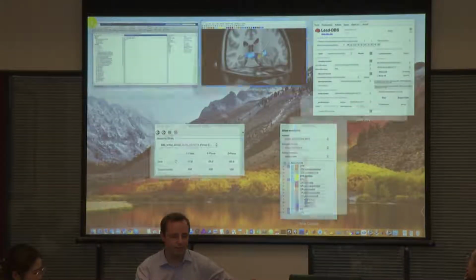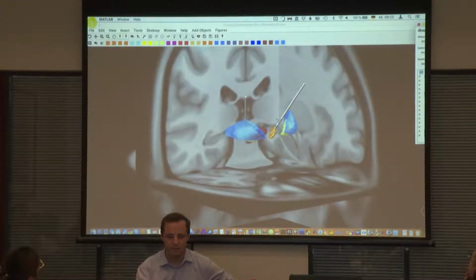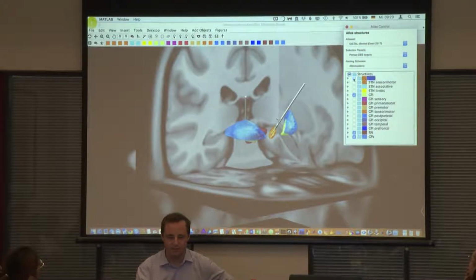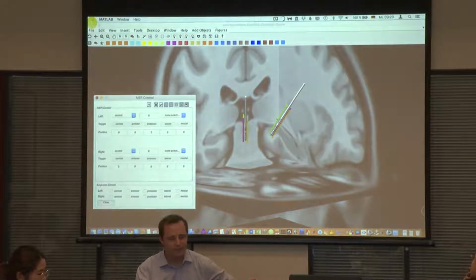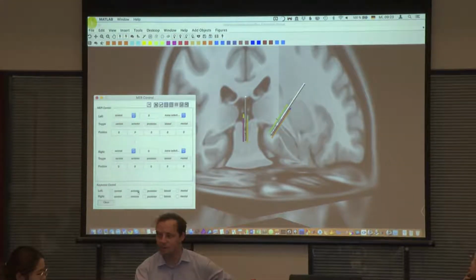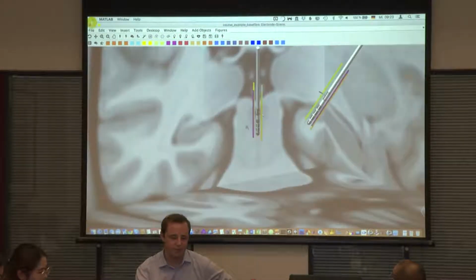So I will have just opened the same scene again. Let's see, it's easy. And I will hide all of these files for now. And then if you click on this button with the flash, oops, some bug with my display, but this button, then you get the microelectrode recording control figure. And as you can see, there are now these 4 trajectories around the microelectrode.